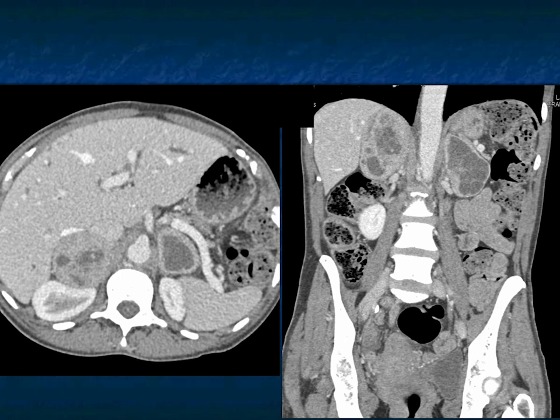Could it be adrenal cortical carcinoma? That's rarely bilateral. Usually it's larger. When it's bilateral, there's one huge mass and a second smaller mass. Mets is a good thought, as we mentioned. But what else? Bilateral adrenal lesions, 10% of pheos are bilateral. So you've got to really consider pheochromocytomas.